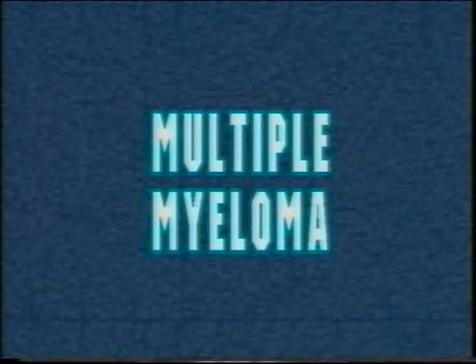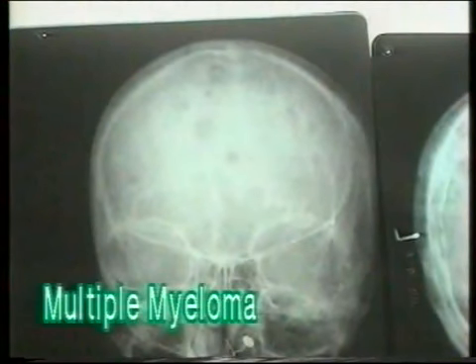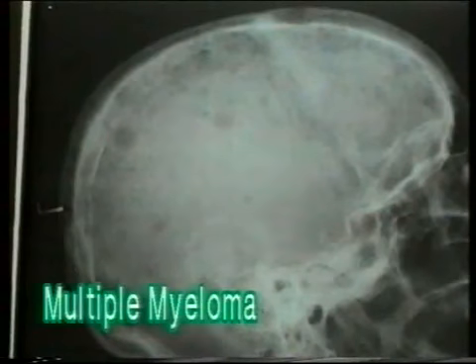Multiple myeloma. This is an X-ray of the skull showing multiple small round osteolytic areas. This is a characteristic appearance of multiple myeloma. The holes are perfectly round as if punched out, and there is no surrounding sclerosis as seen in osteomyelitis. This is a lateral view showing the typical punched out appearance. The holes are 2 to 5 millimeters in size but may join together to form larger ones. The humerus also shows the osteolytic lesions.